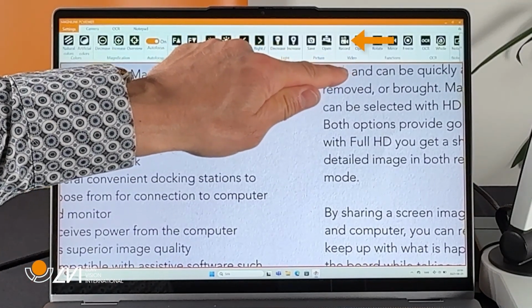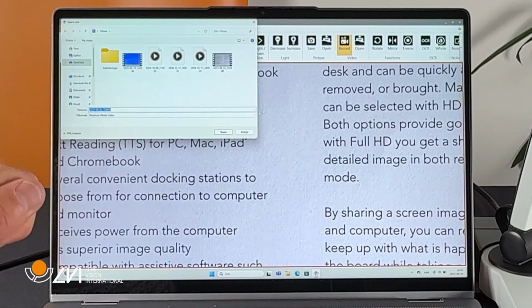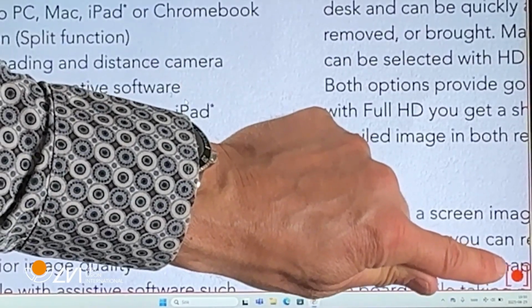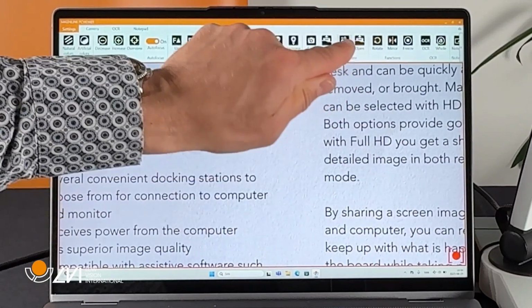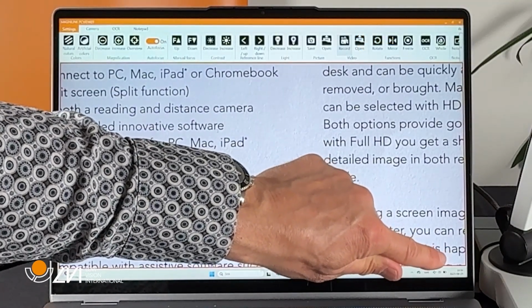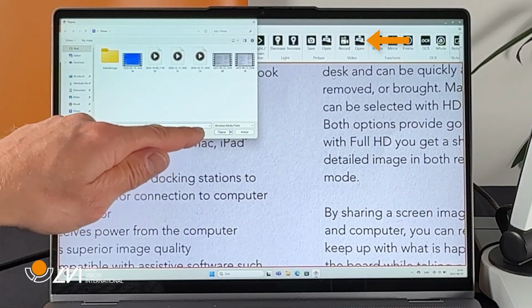Video recording. Press Record to record a video. Today's date and time is chosen as standard for the file name. A red recording symbol is now activated and shown in the lower right corner. Turn the recording off by pressing the video recording button again. Video recording stopped. The recording icon in the lower right corner is now gone. The next button is used to open a recorded video.